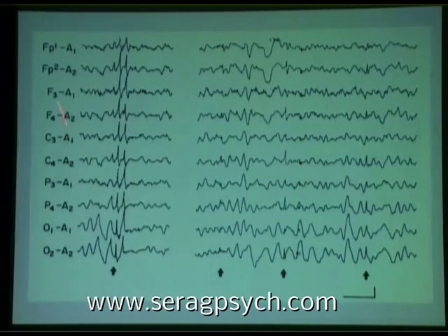So therefore, you'd have to think maybe that these spike-like discharges are not coming from FP1, FP2, F3, F4, O1, O2. Maybe they're coming from A1 and A2. That's a possibility. How do you prove that? Change the montage to a reference montage, correction, a bipolar montage, and see if you still see them. That's what you can do now with digital EEG.